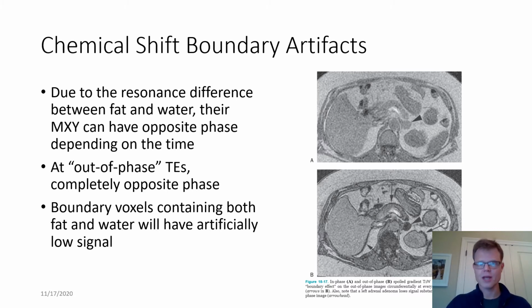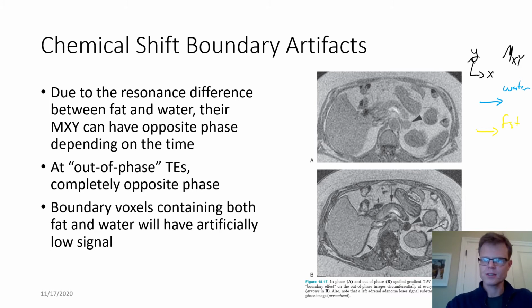And so you end up with a phenomenon at the right, where the top image here is acquired when, if we look at the transverse magnetization at a time when water and fat, and again we're observing transverse magnetizations, are pointing in the same direction.